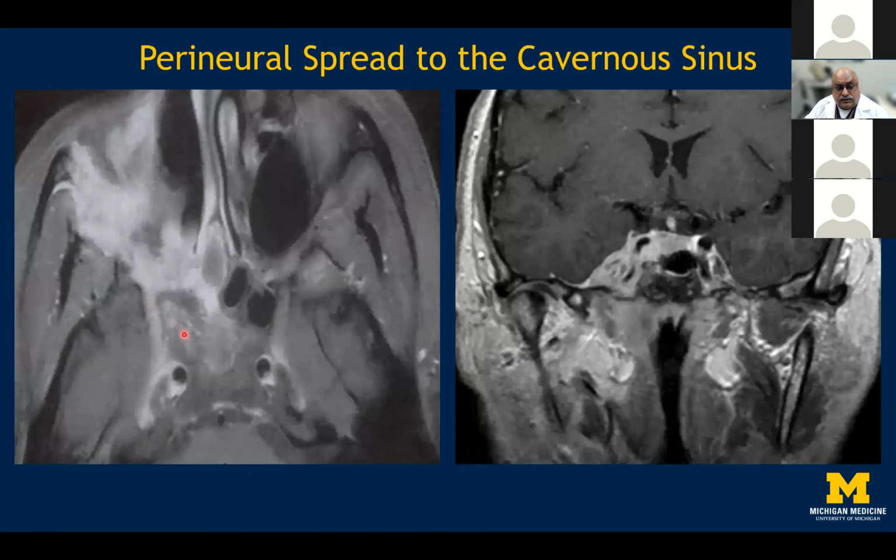Perineural extension is shown here very nicely in a tumor in the maxillary region, with involvement of the pterygopalatine fossa, as well as the foramen rotundum, the cavernous portion and the cavernous sinus. So in one big sweep, we can see the major areas of the skull base which are involved, together with the infiltrative aggressive changes in the marrow spaces of the basisphenoid.